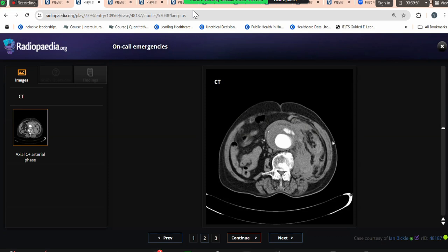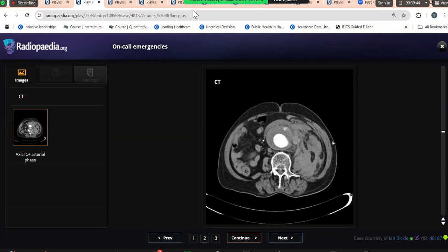This is most likely a case of ruptured abdominal aortic aneurysm, and there is active contrast extravasation with retroperitoneal hematoma formation. In this case, I would discuss the findings with the referring clinician, and I would pick up the phone and urgently inform the interventional radiology team of these findings, as there is active bleeding. The patient might be in shock, and after acute management of the shock, I would discuss regarding angiography and further management.